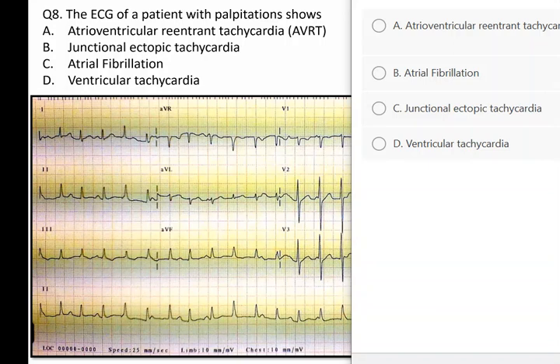I put this ECG, this is a rare ECG, and a little difficult, but this should make your concepts about AV dissociation more clear.